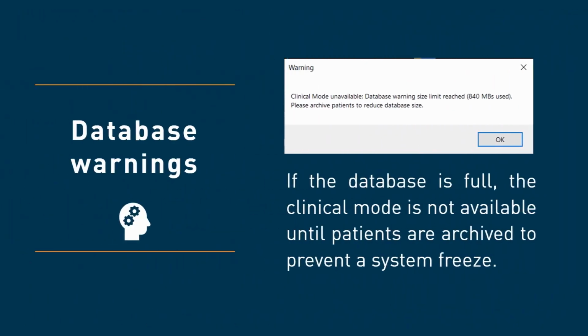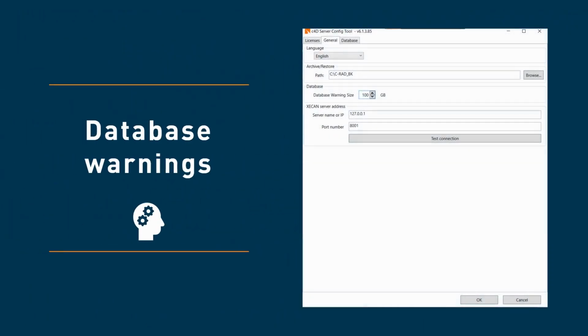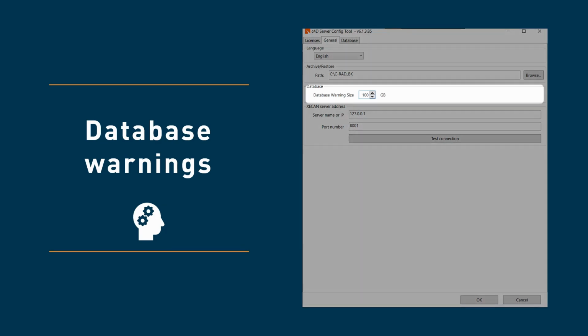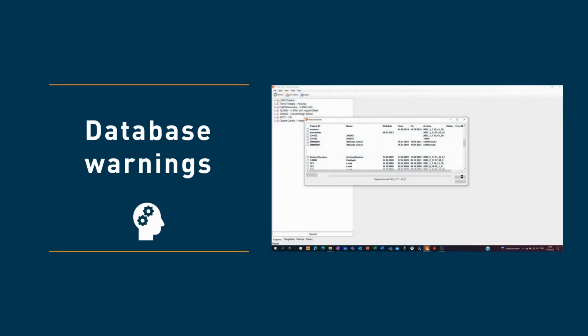The database warning level can be configured in the c4D server config tool and is set by the CRAD field service engineer according to the available disk space. I recommend performing patient data archiving regularly depending on your system, at least once every quarter or more often if you have more systems connected to your c4D server. Please check out our video for how to archive patients for further information.